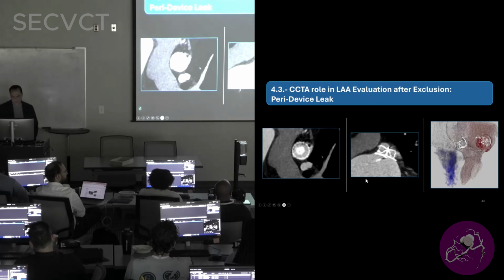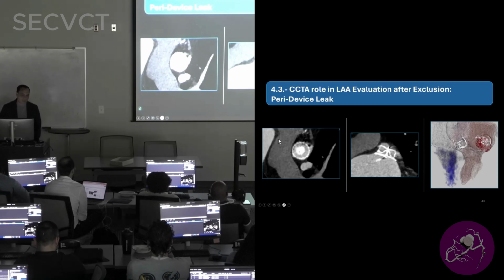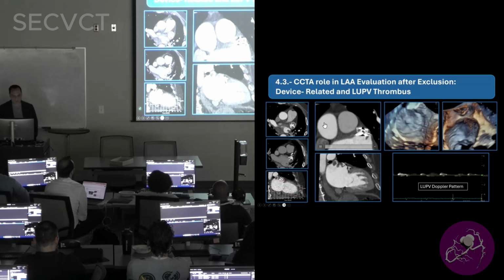This is another patient of ours in which you see this lobe. Unfortunately, left atrial appendages are not made for devices, but this is a patient that had a lobe that was not completely excluded, and you have to be forthcoming, and this is a patent left atrial appendage. The question becomes what the vena contracta is, and whether you feel comfortable that the risk for thromboembolization has been mitigated with respect to the risk of bleeding. That's a joint decision with the patient, and if it is greater than 5, there may be an indication for closure or not.